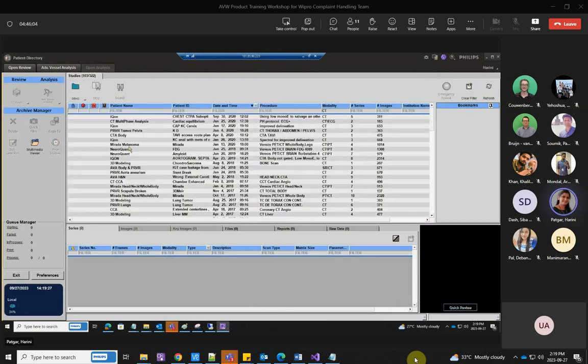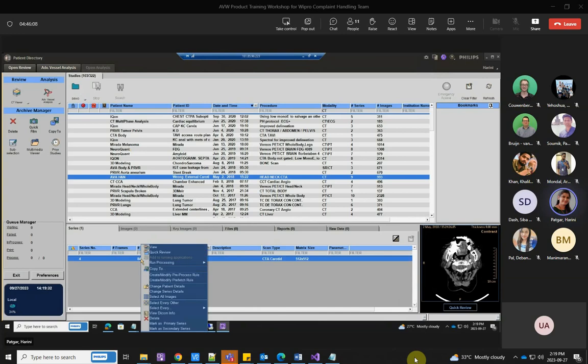Yesterday, I tried to run processing and keep it just for a show. To show, I'll try to launch once. If it starts processing, maybe you people can do it later. So let me keep that processing on.